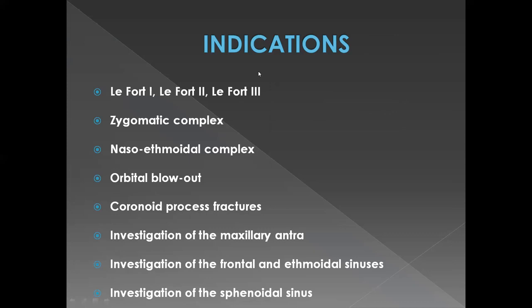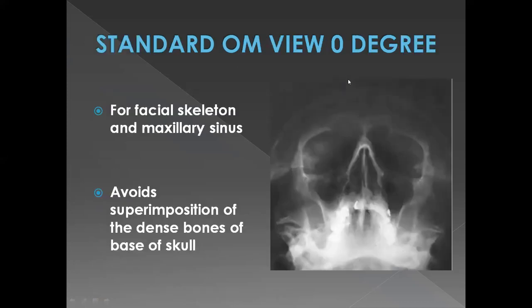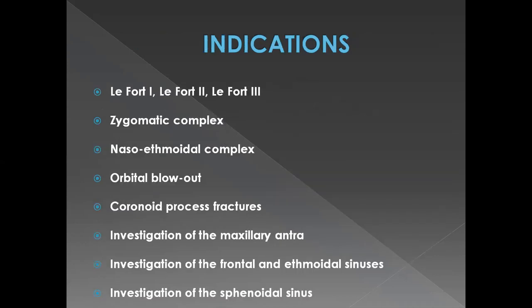All right. So this is, let me just go back to the 0-degree view. This is the 0-degree view, and just showing you a picture of it. बाकी तो चीजें मैंने आपको verbally उस पे वो बता दी थी. But here we'll compare it with the rest of the X-rays, and maybe then you can have a much better idea of how to differentiate between a 0-degree view and the other views.